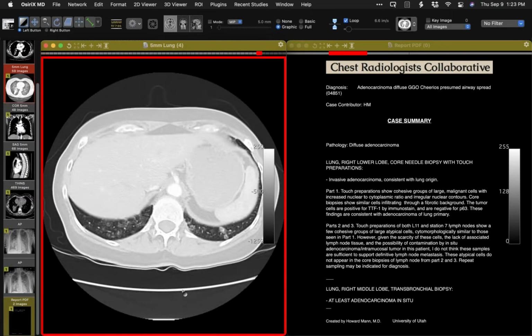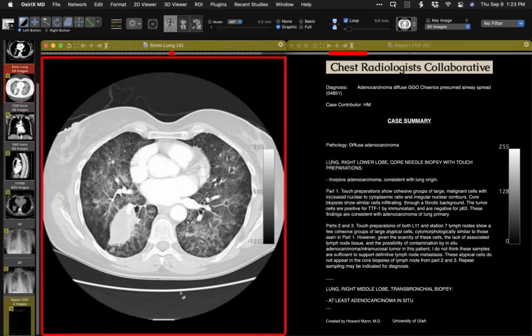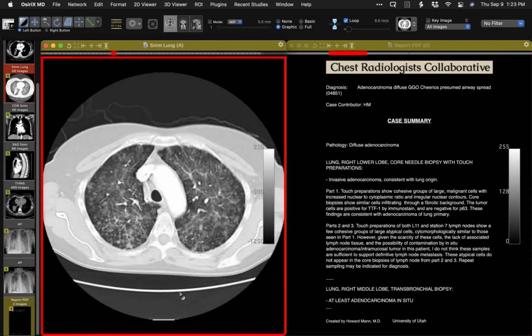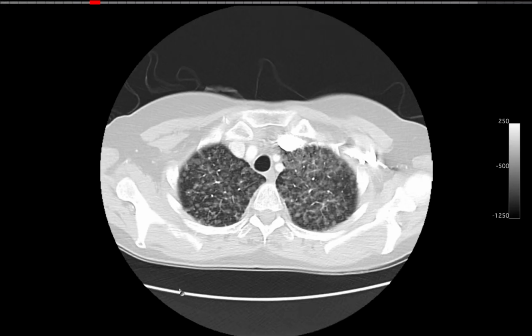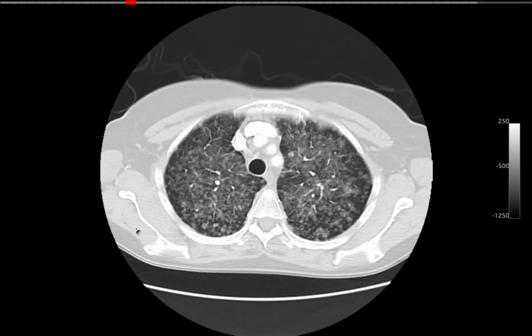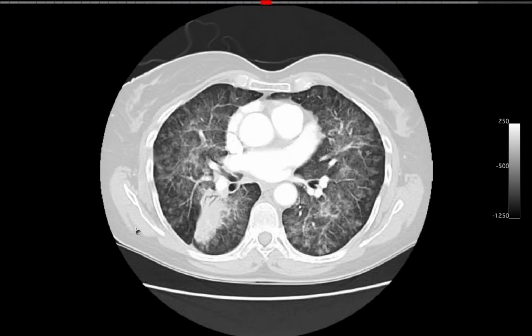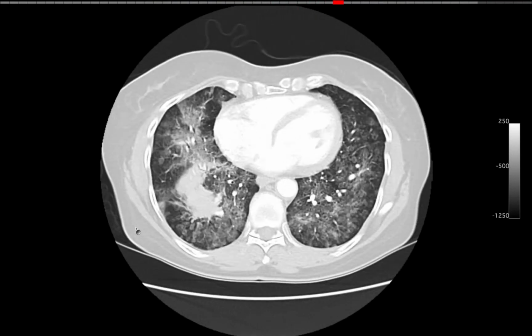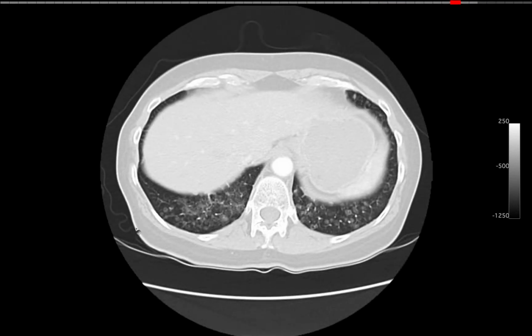Yeah, I think the last one we saw like this, Travis, I think you showed the Cheerios with the adenocarcinoma, if I remember correctly. This is a remarkable case just because you have different morphologies. Like you show there, there's just more fuzzy ground glass nodules in the upper lobes and then more confluent ground glass and consolidation and then Cheerios. It's really interesting. Very. Yeah, pretty dramatic.